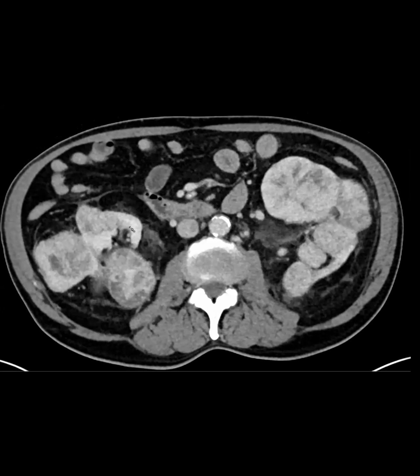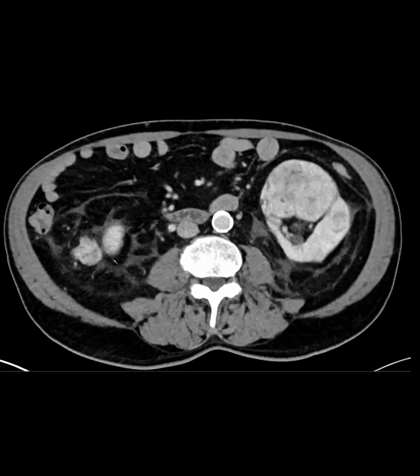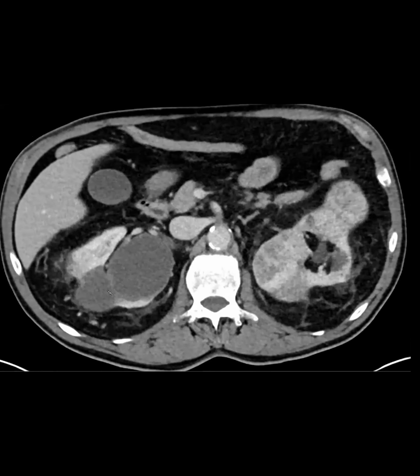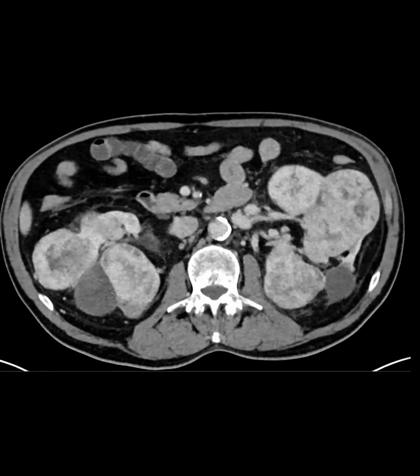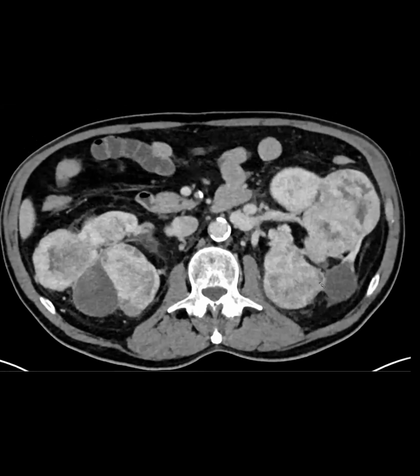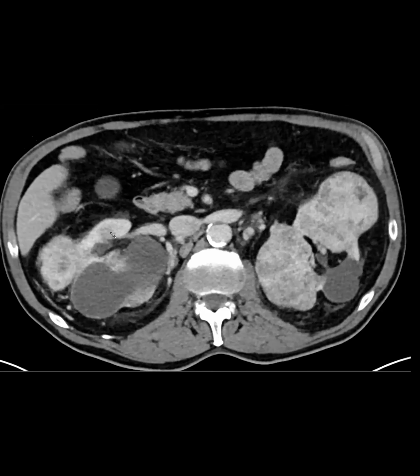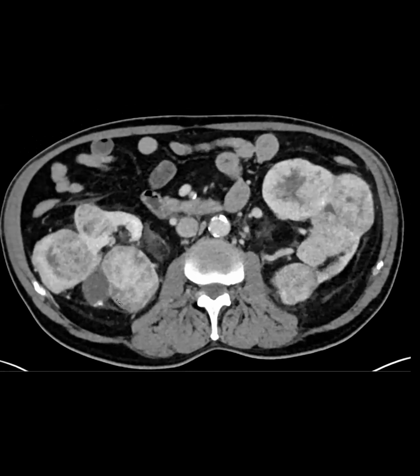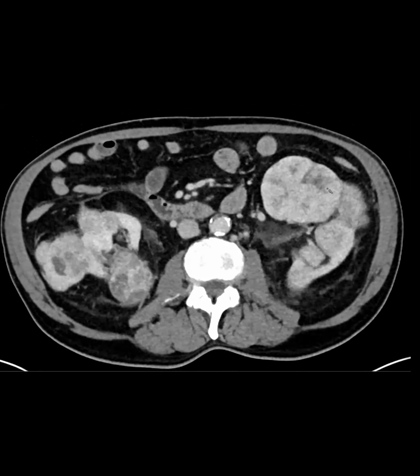And you can see here that the renal parenchyma is getting more and more taken over by these lesions. So the main risk here is chronic renal failure. So our patient, they're just watching them, hoping that this kidney hangs on long enough, all this parenchyma here, but they're not going to go out and take out some of these. It's different than in VHL, where when they get larger than 3 centimeters, we start talking about doing surgery because of the higher risk of metastatic disease.